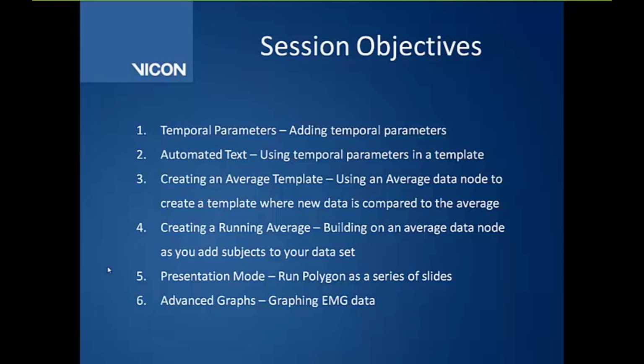We're also going to talk a little bit briefly about the presentation mode, how you can run Polygon as a set of slides rather than just a report to be read. And we're going to discuss the advanced graphs, how you can graph EMG data.